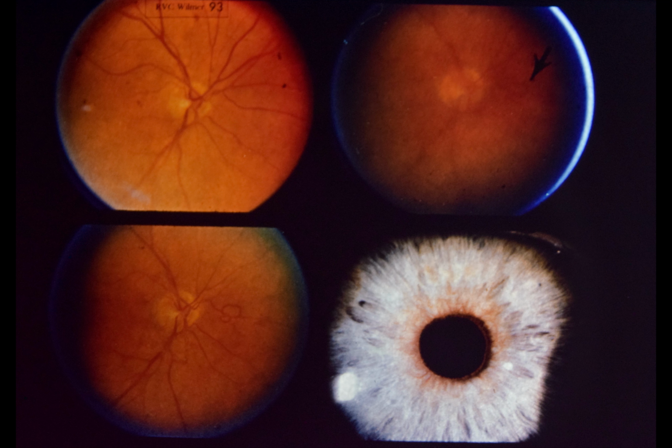Upper right is a 1975 photograph taken several days after a vitreous hemorrhage which obscured fundus details. Despite vitreous blood, one can see a venous loop nasal to the disc and a suggestion of disc neovascularization as well. Lower left, note disc new vessels in a photograph taken 2 months later when vitreous hemorrhage had cleared.